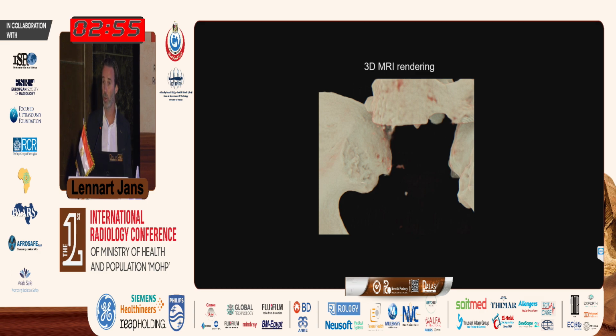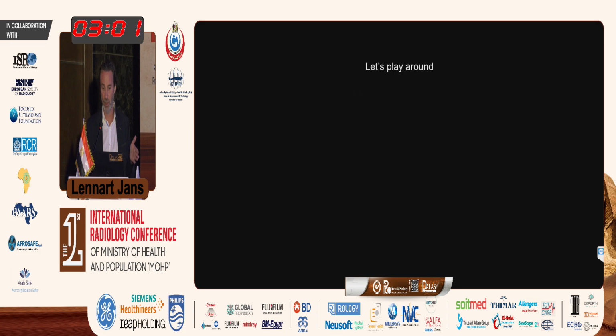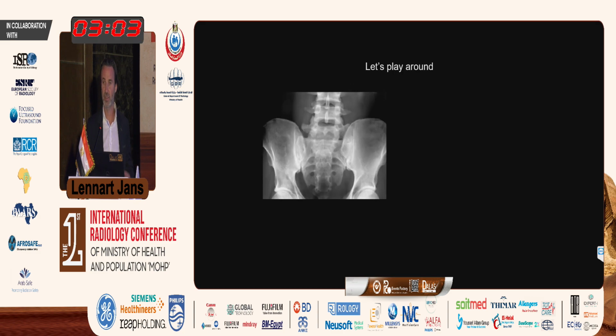And we all know that if we would project a CT in one plane, we get a radiograph. So we can do this here just as well. So this looks like a radiograph, but it's an MRI. Right? So we have projected all the points of the synthetic CT in one plane, and this does look like a radiograph.